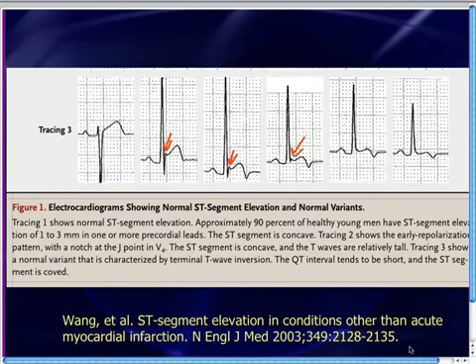That little notch doesn't have to be in all of the leads, but in some of the leads you get that little notch, and then, like we talked about just a moment ago, right after the fishhook you get a concave upwards ST elevation, and then it drops down into that inverted T wave there. It looks for all the world like Wellens, except you have to remember there's high voltage, there's a fishhook, and it's concave upwards before the drop.